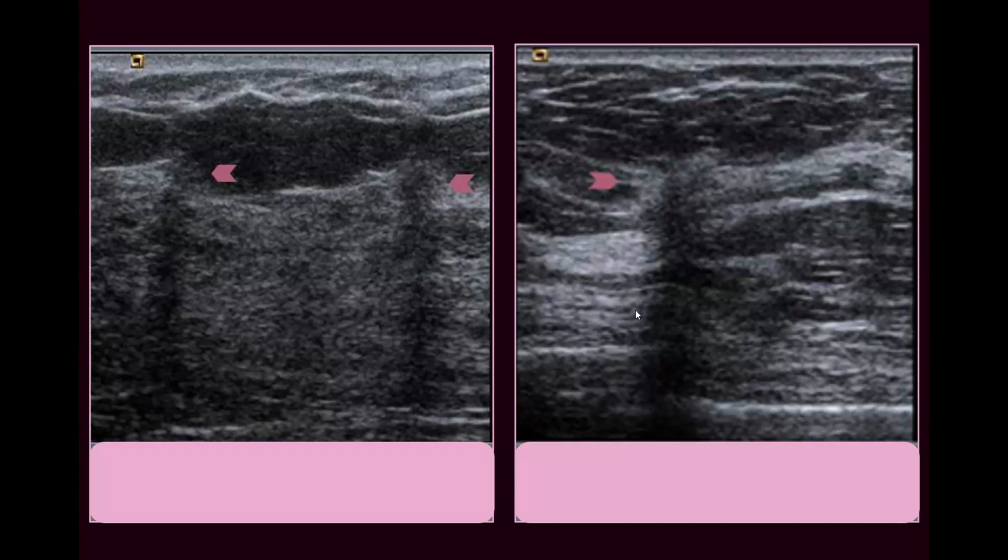You can unmute if you want to share. Any suggestion? Any difference between these two images?